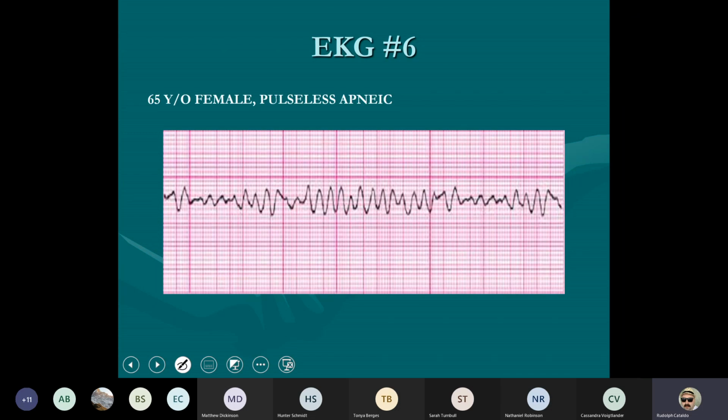Oh boy. Alex Fulton. Tell me my rhythm. Don't sound scared. Tell me your rhythm. I want to go with VFib. Go with what? Speak up. VFib. Okay. Why is it VFib? Heart's kind of just tremoring. You're not really getting anything for a rhythm. Okay. Tremoring, not really getting a rhythm. Can my patient have a pulse in VFib? No.